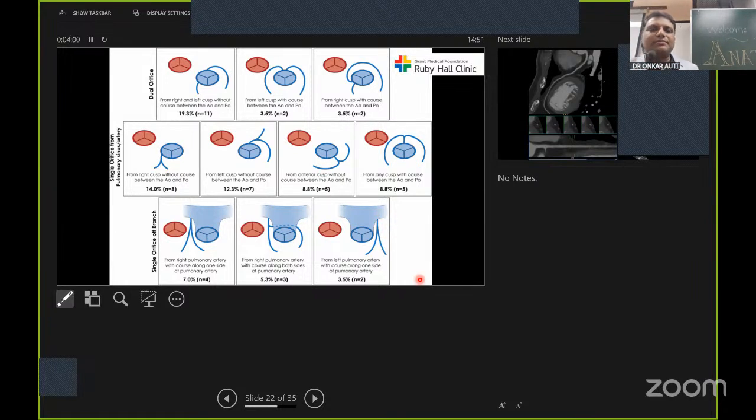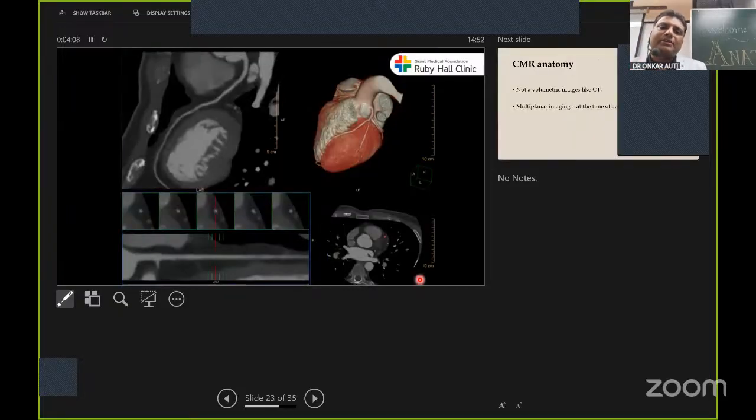So this is one aspect of your coronary angiography, to assess the anomalous courses. The most important aspect of coronary angiography is to assess the stenosis or blockages in the coronary artery, which are responsible for heart attack and sudden cardiac death, right? So these are the different tools we have at our workstation, which includes a 3D model. This is called the MPR view, where you can see from start to end. This is the LAD picture over here. Start to end, you can see the straightened view and the cross-sectional view, so we can determine if there are any plaques, soft plaque or calcified plaque, and how much obstruction, how much stenosis it is causing to that vessel.